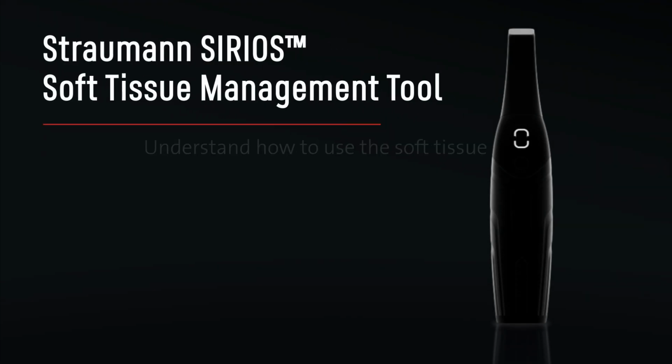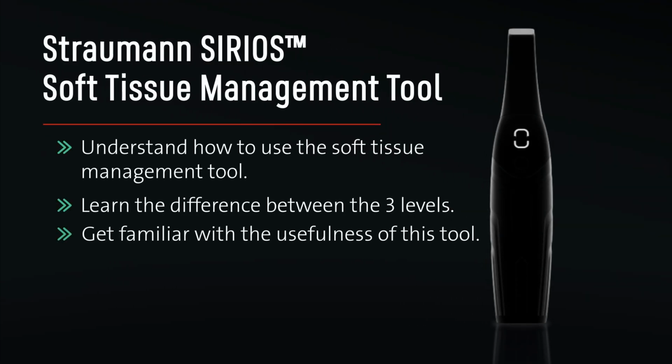Straumann SIRIOS soft tissue management tool. Understand how to use the soft tissue management tool. Learn the difference between the three levels. Get familiar with the usefulness of this tool.